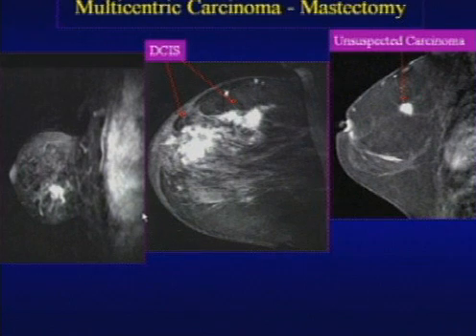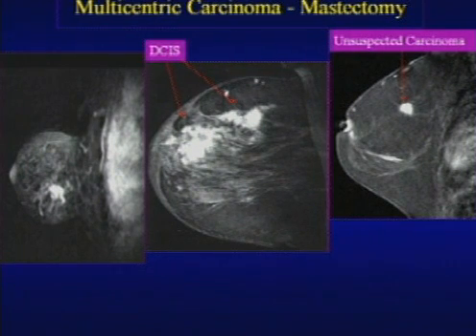So if the surgeon were to go in there and just remove this palpable lump, he may or may not get positive or negative margins. However, despite giving radiation and chemotherapy, you can see that there is extensive disease that is left behind in the breast, and this patient really is much better served with a mastectomy.